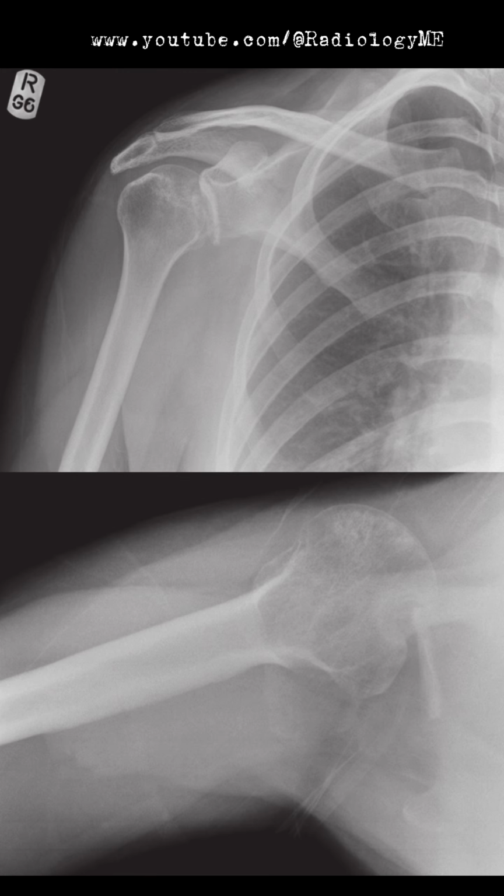Now, an examiner might ask me, how would you assess for shoulder dislocation on plain film? Well, the key is to look for congruency between the humeral head and the glenoid fossa. In posterior dislocations, the humeral head may appear locked in a fixed posterior position relative to the glenoid. You may also see signs like the light bulb sign, where the humeral head appears rounded due to its internal rotation, or the rim sign, where there's widening of the joint space due to the posterior displacement.